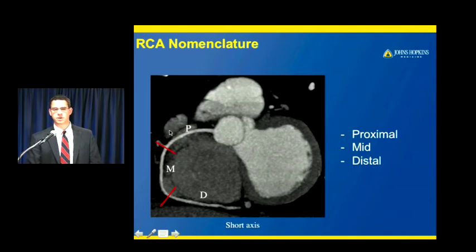And so there's no vessel that defines the interface between the proximal and the middle portions. It's more an eyeballing thing where you basically just see where is that transition from the more horizontal to the middle vertical portion. The acute marginal branch is going to come off usually around this area. That's the acute angle of the heart where the vertical portion meets the inferior horizontal portion.